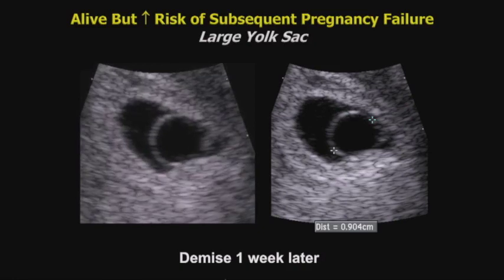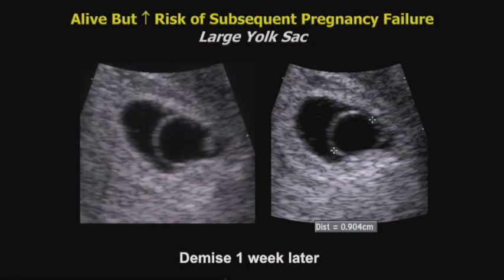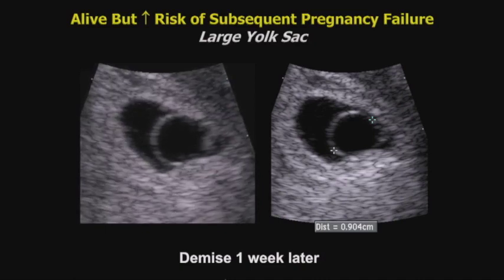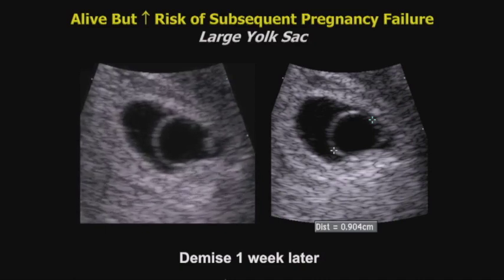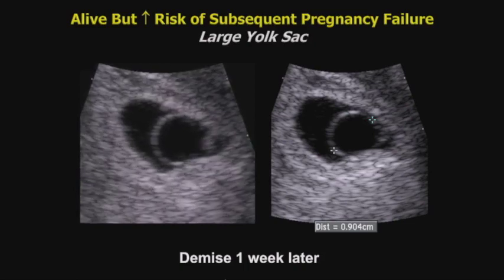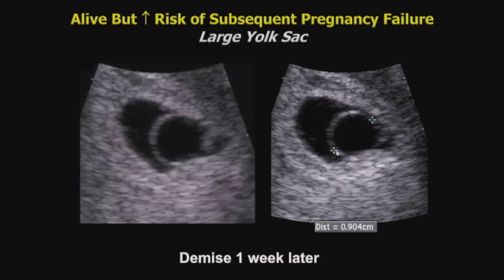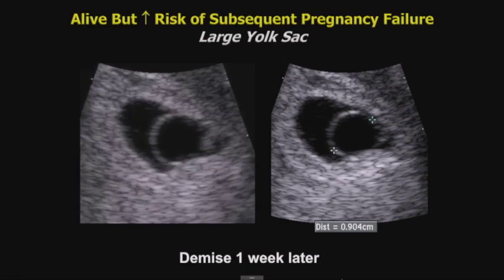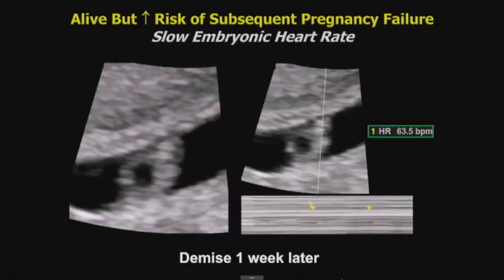And then a few findings that I listed that when there is a live embryo, in other words, an embryo with a heartbeat, there's a high risk of subsequent pregnancy failure, including a large yolk sac measuring 9 millimeters. Anything over 6 or 7 millimeters indicates a high likelihood of subsequent failure.